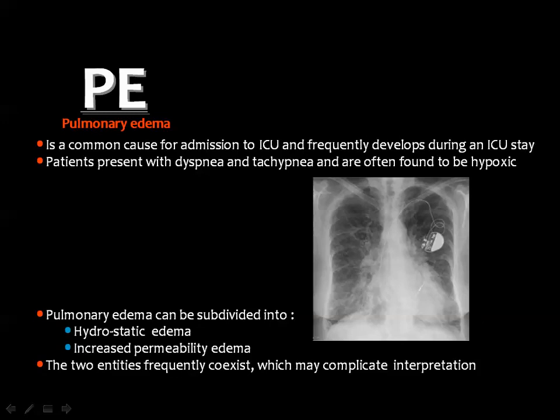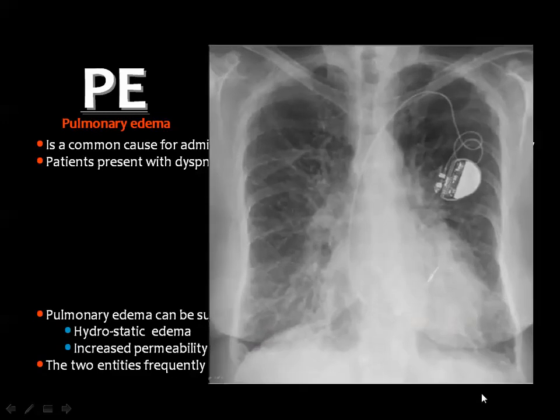Then we come to pulmonary edema, and this is a common cause for admission to ICU. And you have two types of pulmonary edema, the hydrostatic edema and the permeability edema. It's worth mentioning that the two entities may coexist and may complicate the interpretation.